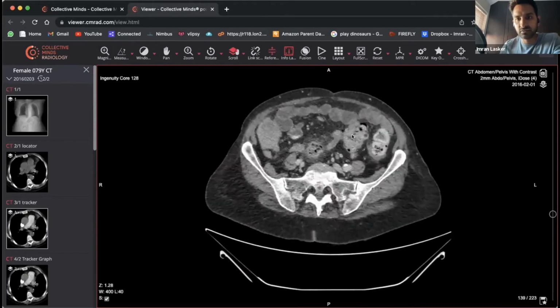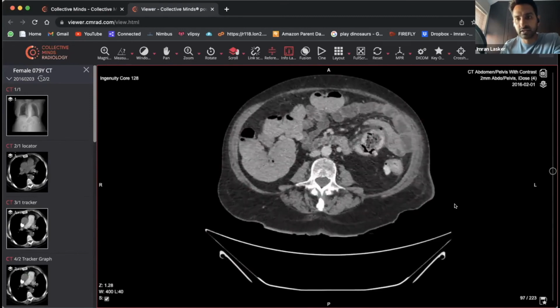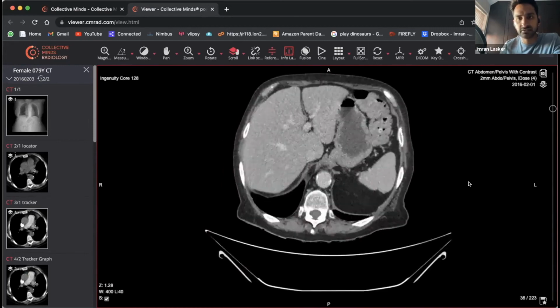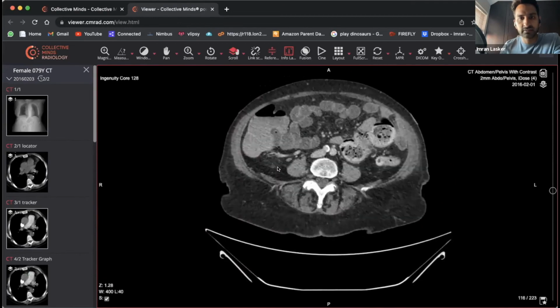And as we follow the rest of the bowel, we're going upwards across for the sigmoid colon, then into the left iliac fossa, coming all the way up again, coming up to the splenic flexure, going across the transverse colon. Let's go transverse colon. Go all the way across now. That looks okay. All the way down. And so we're sitting somewhere in the region of the cecal pole, and everything looks okay.